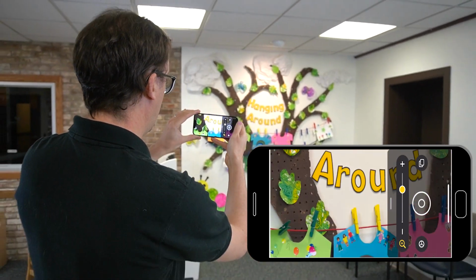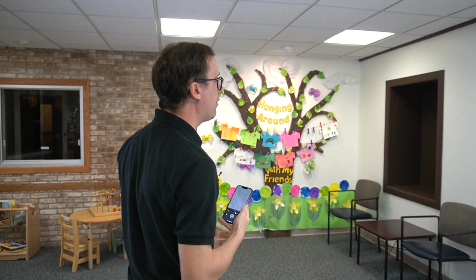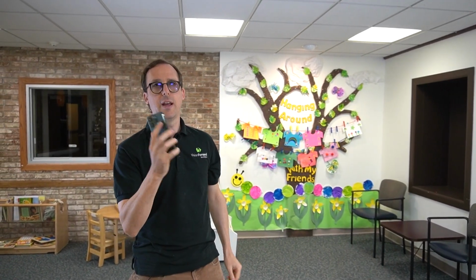our regular view again. So a very similar experience between the two apps again, as you would imagine, because they are both using the same piece of technology with the same camera. However, ReBokeh does have that little bit of image stabilization, which does seem to help a little bit.